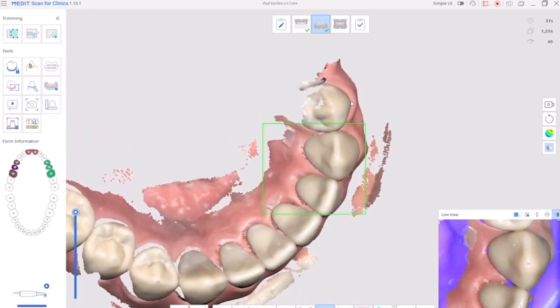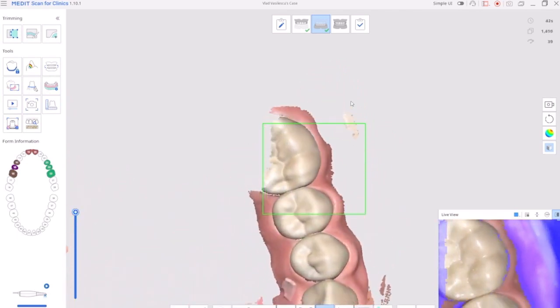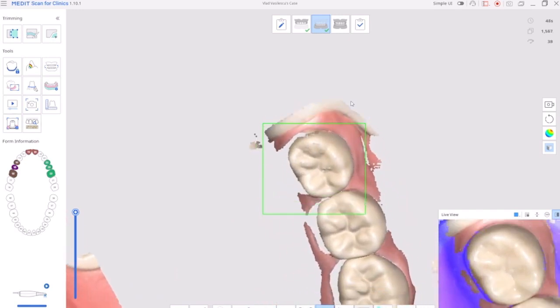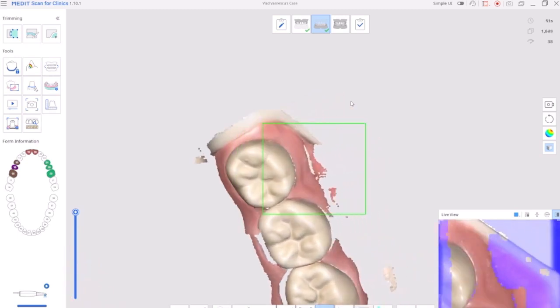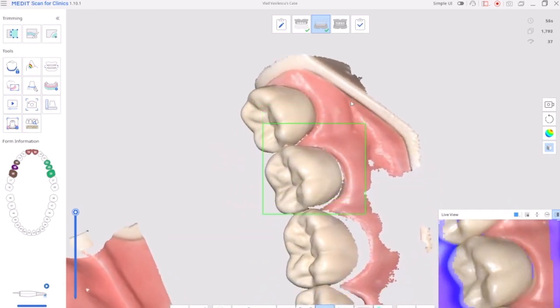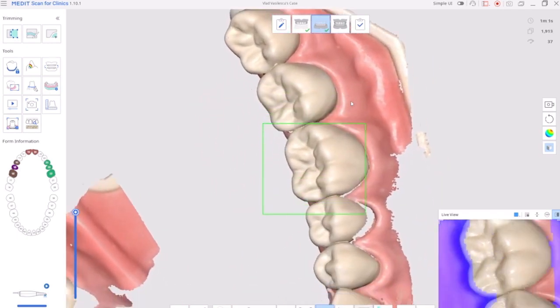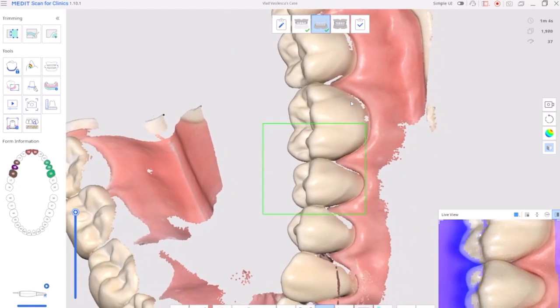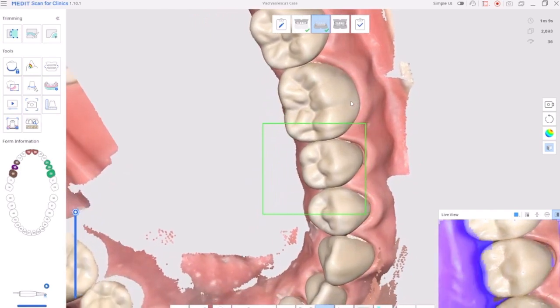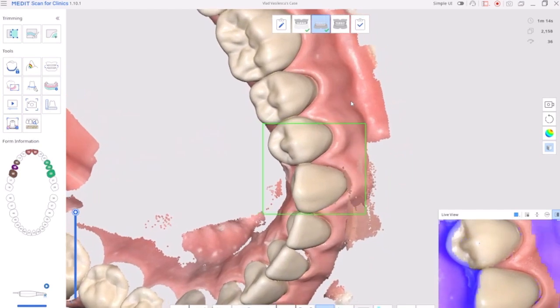If you teach the scanner to understand this, many scanners already now have artificial intelligence. They know what to scan and what to remove from the scan. And they even know what not to scan at all. This is a slightly older scanner. Modern scanners do the job faster and better. So I have to fix the image on already scanned surfaces. So we keep going on the front now. We come back to the front.